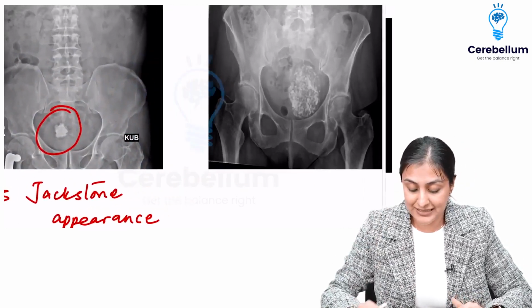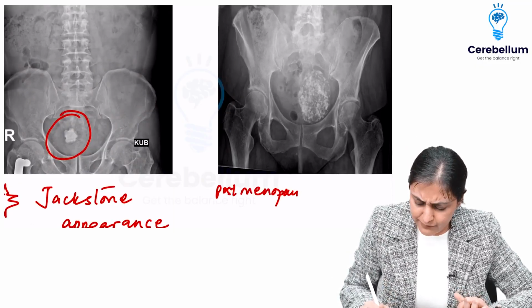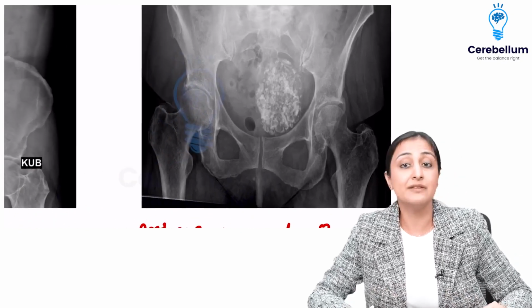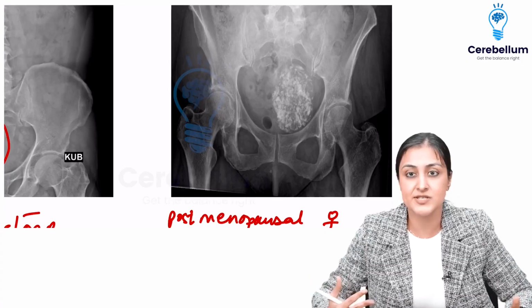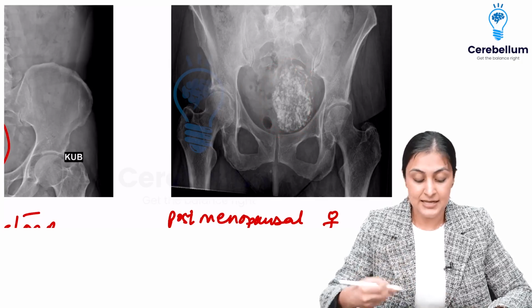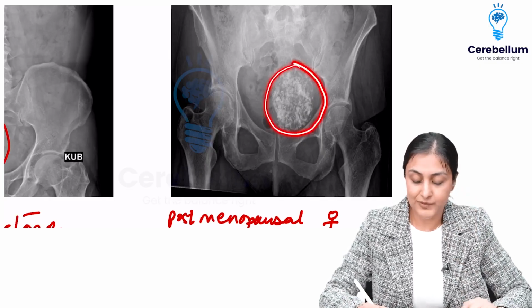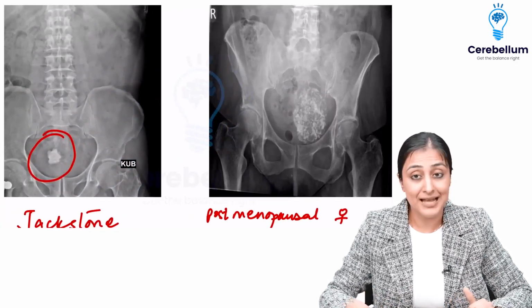You frequently get this question wherein they'll give you, this is a post-menopausal female. First of all, is this a UB stone? Everything in the pelvis is not a urinary bladder stone. What does a female have in the pelvis? A uterus. Sometimes a fibroid can grow to great sizes, and as menopause happens, the fibroids tend to undergo atrophy with calcification. So first of all, why is this not a bladder stone?